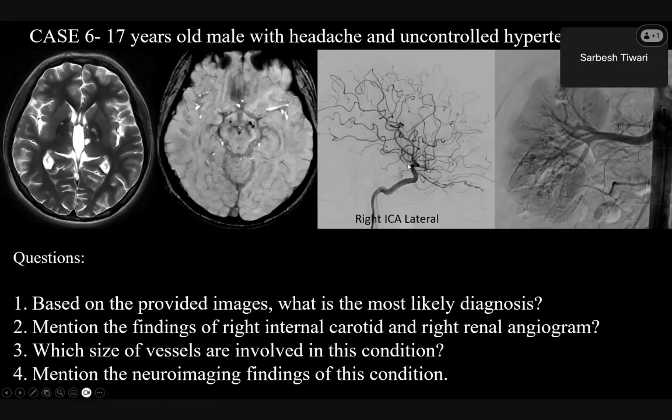Caudate atrophy. All right. Then what are these lesions where I'm pointing my arrows? What are these lesions here? Chronic infarcts. Very good. So you have chronic infarcts involving bilateral basal ganglia and thalamus. What is happening on the SWI? No one is typing. Okay, so on the SWI, these are microhemorrhages. So you get multiple microhemorrhages in the area of the cerebral peduncle, and maybe possibly a small area of SAH as well. Fine.